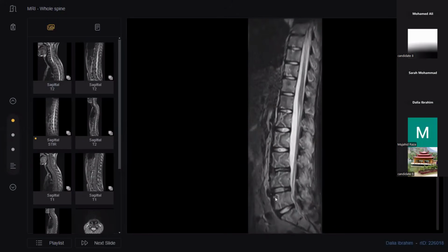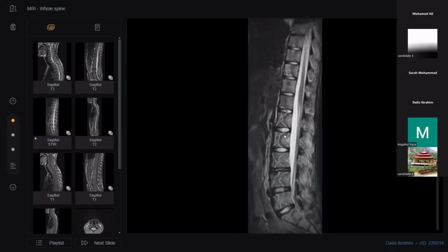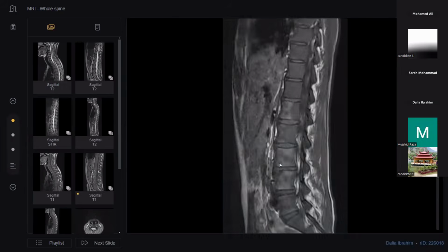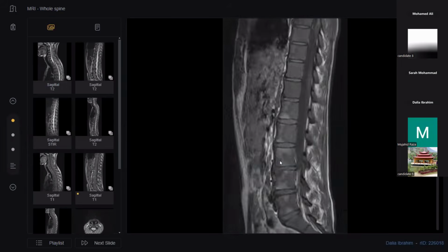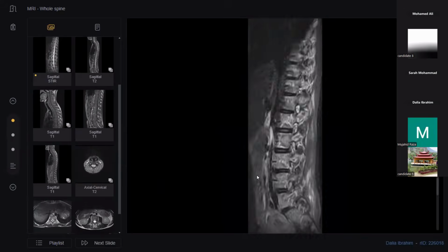These geographic areas. Okay, the geographic areas in the lumbar. Yes. Is there someone? I have no idea about it. Okay, in the T1 it appears a little bit high. Yes. Okay. Does this appearance remind you of any disease, any pathology?